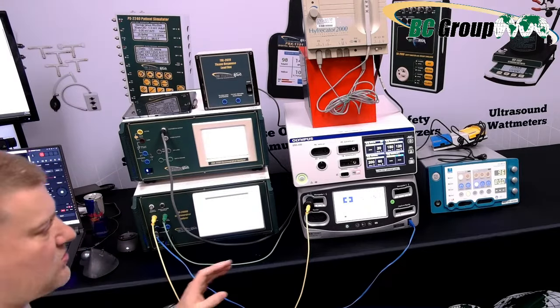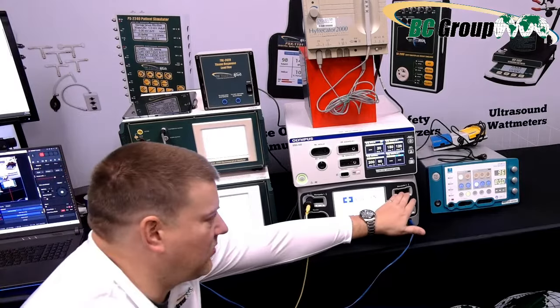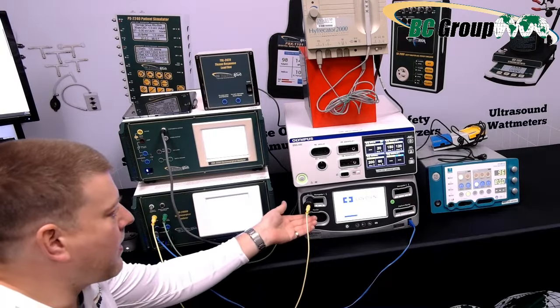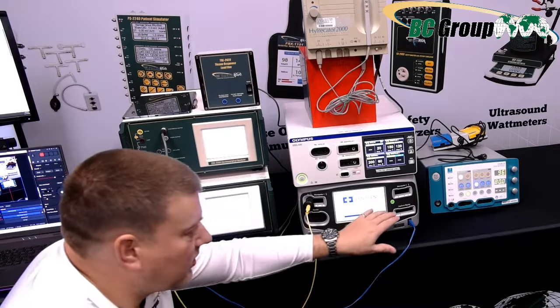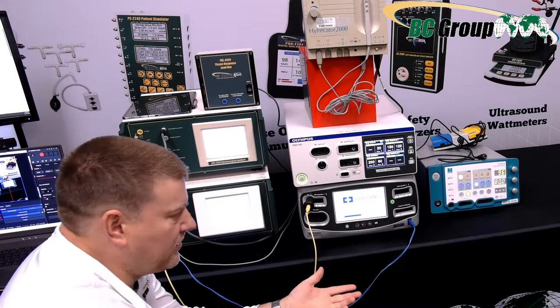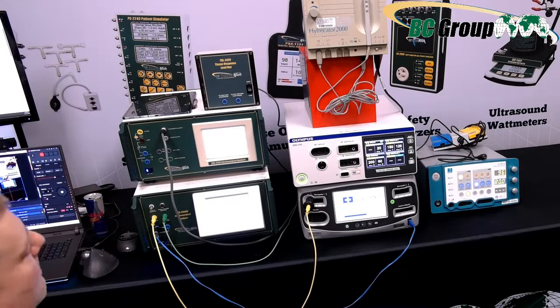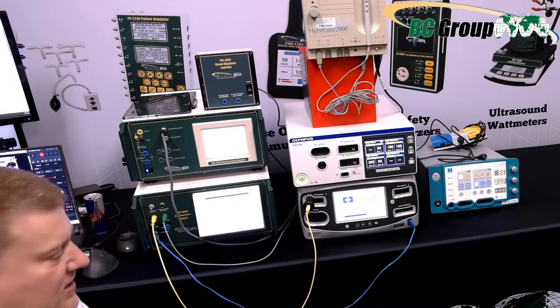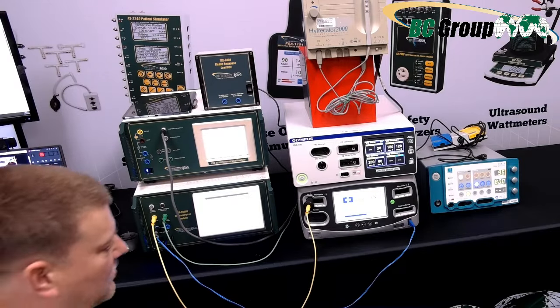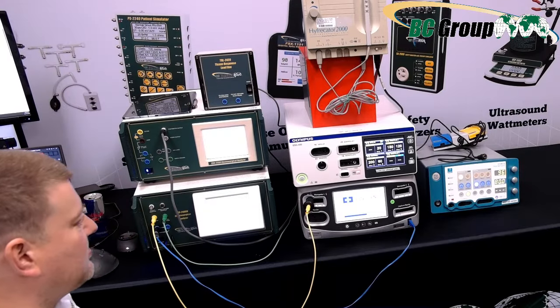The good thing is regardless of what manufacturer you go with, they've somehow standardized on what type of ports we have, which means that monopolar and the bipolar are going to be semi-universal. So if you are the old school method, which means you are using a pen, most pens will work, but they're not a safe way of testing ESUs, okay? We are dealing with many, many volts, so we are trying to do things as safely as possible.